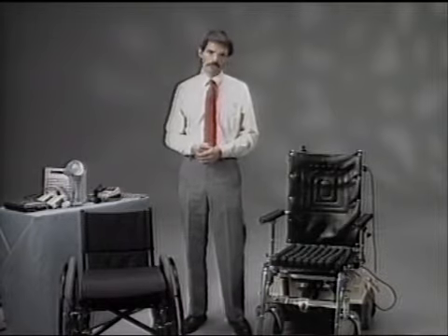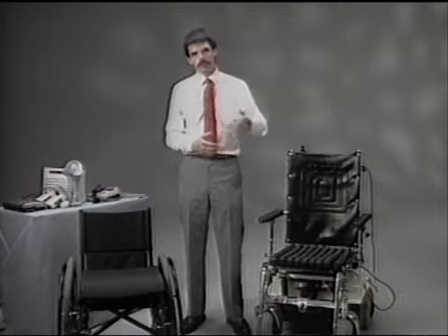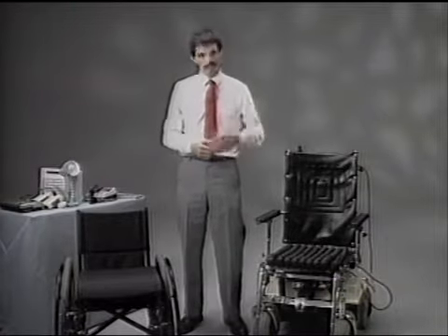And if, for example, you're at the grocery store, at the beginning of an aisle, selecting foods, and the person who's pushing your cart is down the end of the aisle, and you're still wheeling as hard as you can to get to the end of the aisle to join them. You can't make good selections if they're way up ahead of you. So we look at manual wheelchairs in a functional sense. If someone isn't able to get around in that wheelchair as fast as the average person walks, it isn't a functional situation. So then we look at power wheelchairs.